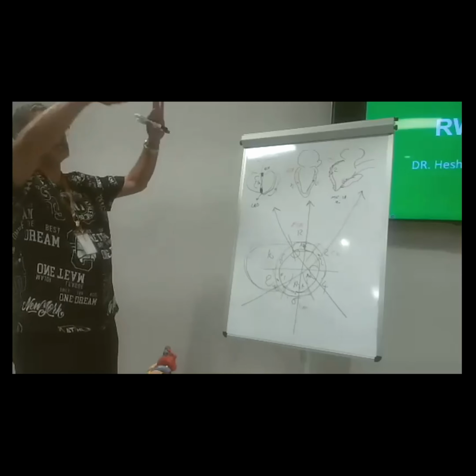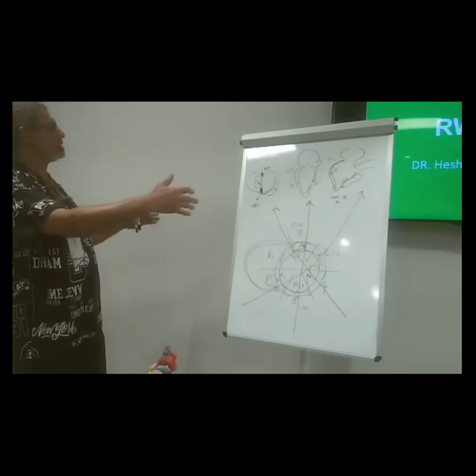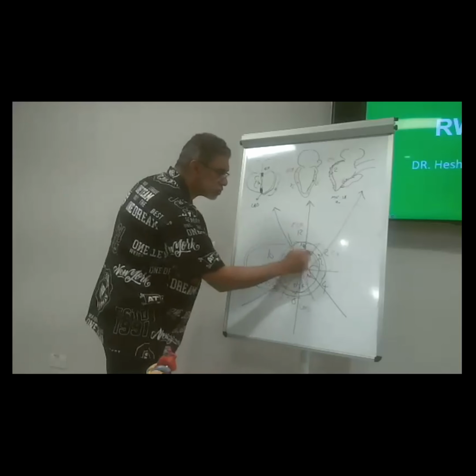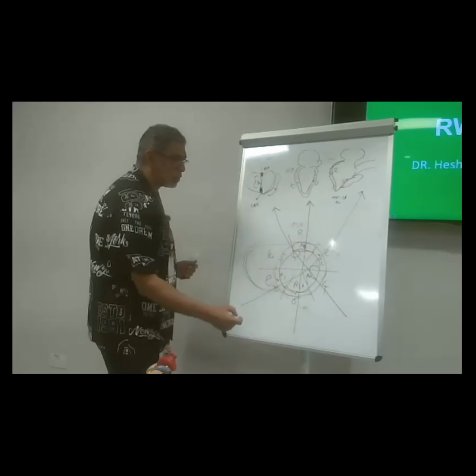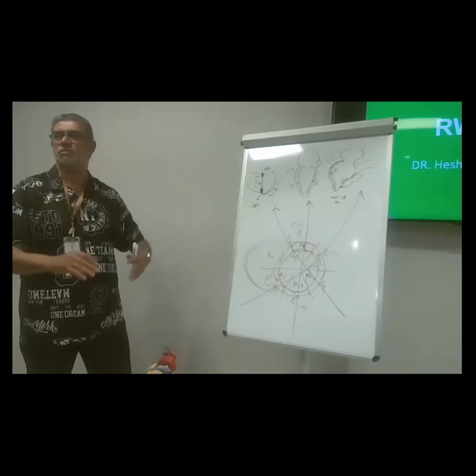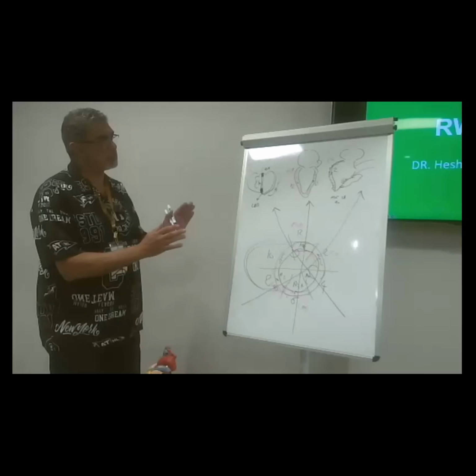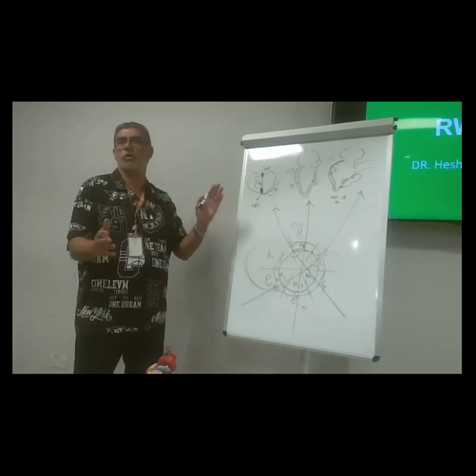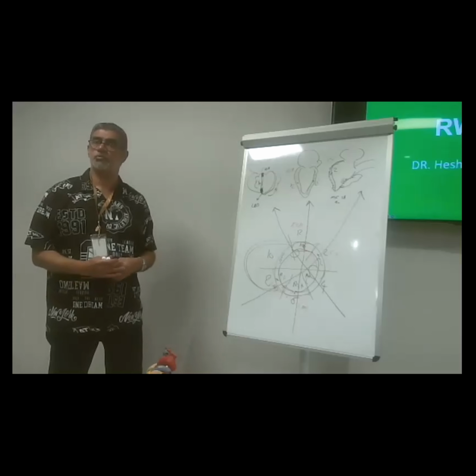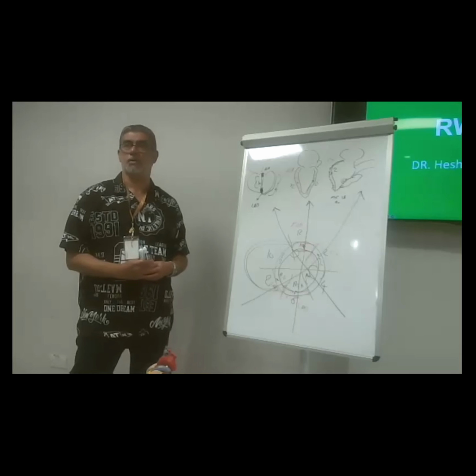Okay, we have the short axis. Be targeted. Go to this area 2. Go to this area 12. Go to this area 6, 8, and then start to comment whatever you want. Okay, so this is the first part of the lecture: the wall. Clear? 2, 12, 6, 8. Simple.